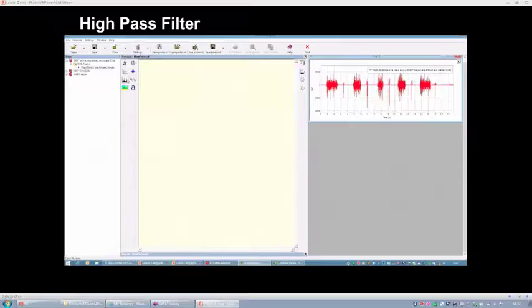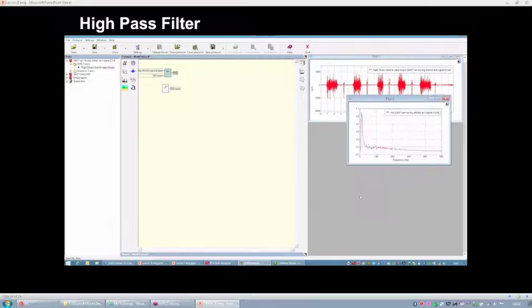Now I want to show you the result of a power density spectrum of a signal containing a very huge amount of artifacts like those. Now I'm defining the time duration of the epoch to compute the spectrum. Again, 500 milliseconds. This is the signal that I want to use.